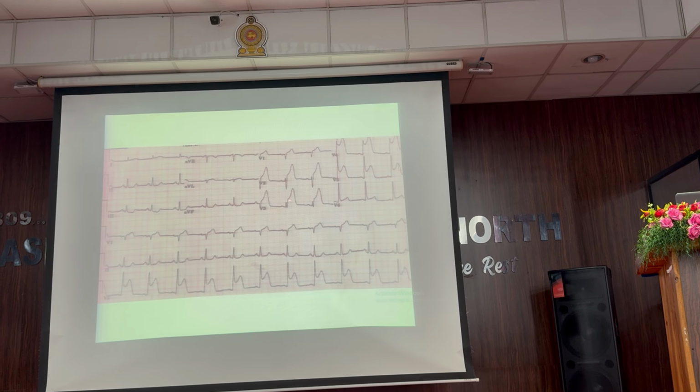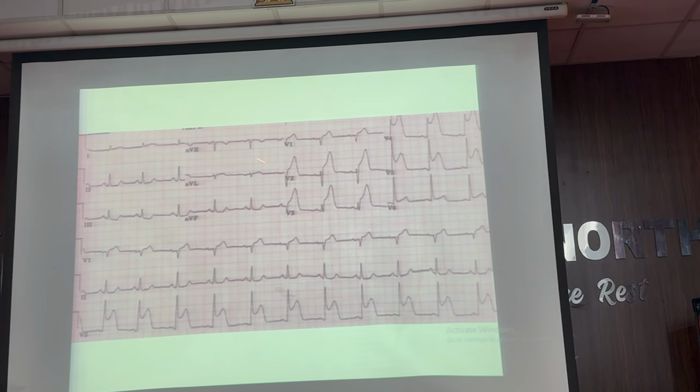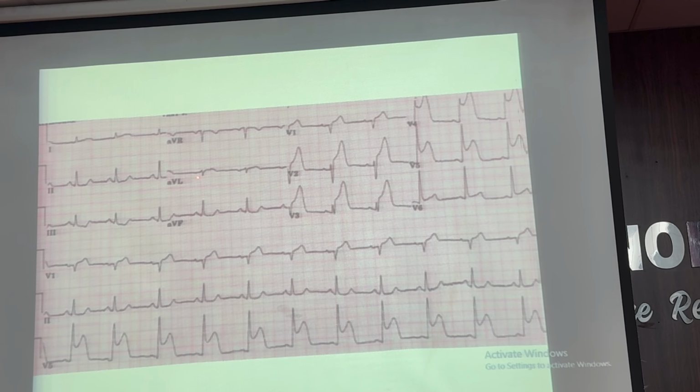Again, it's an anterior STEMI. So you see ST elevations, it starts here from I and aVL as well. So it's basically an extensive anterior STEMI. And because it involves the high lateral leads, you could see the reciprocal changes as well here.